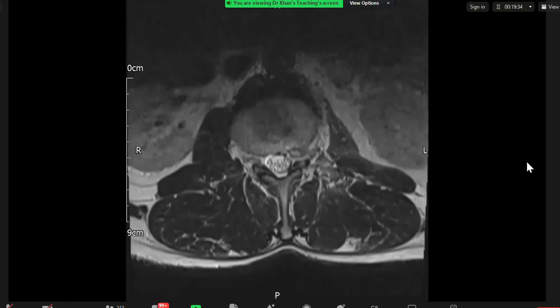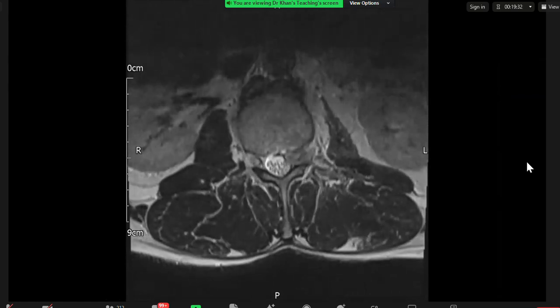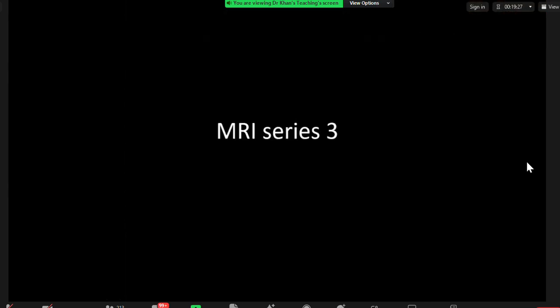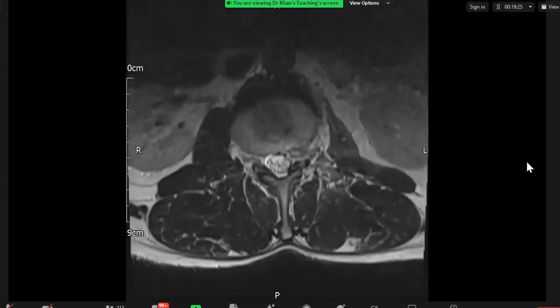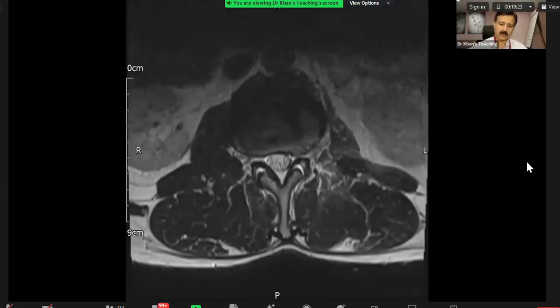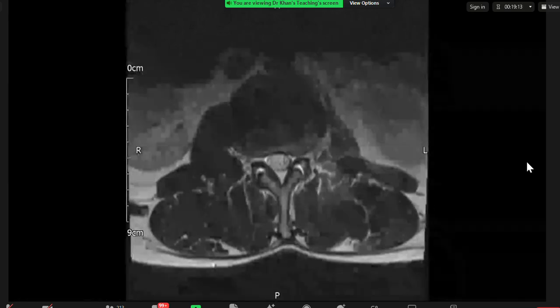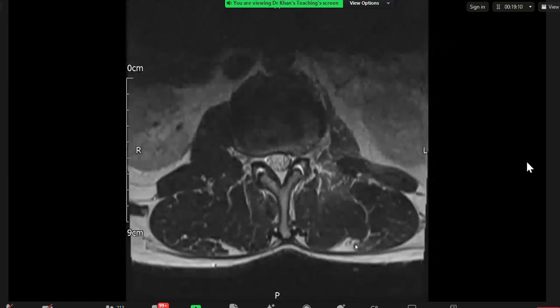So it's the superior most. This thing here. You see this thing? Yes. So what is your conclusion now? That there is a bony extradural lesion at that level that represents it. It looked quite separate, or it could be a sequestrated disc, I suppose.